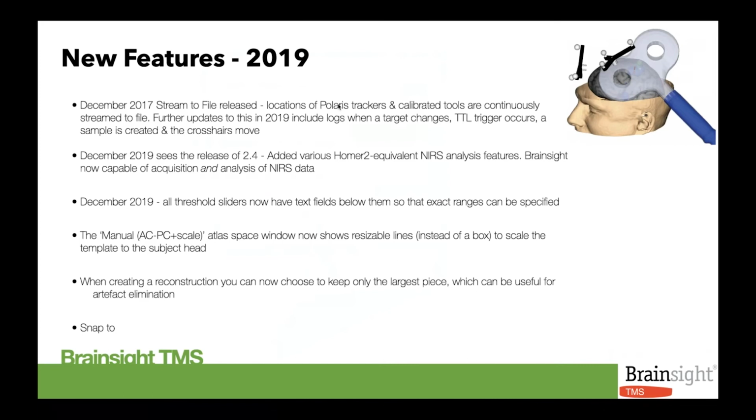So we always had some grid nodes in the middle of the grid that were perfectly tangential to the surface, but those on the extremities of the grid would not be quite correct. But now this snap to tool, which is the most simple little button, is great. It means that all those grid nodes are snapped correctly to the surface that we're going to be stimulating.